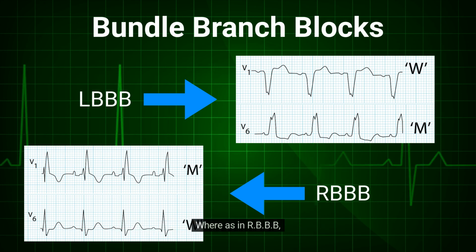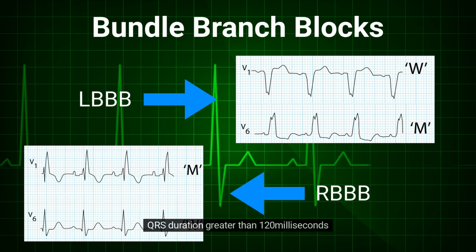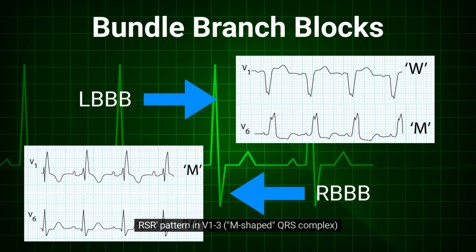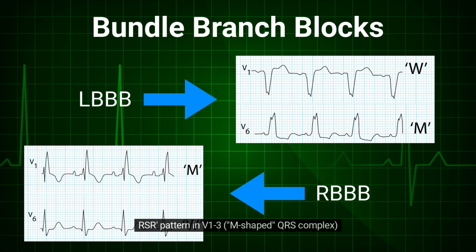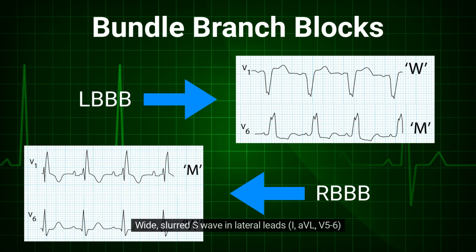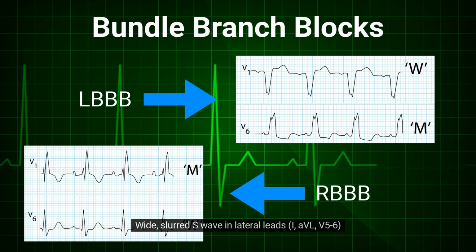Whereas in RBBB, QRS duration is greater than 120 milliseconds. RSR pattern in V1-3, M-shaped QRS complex. Wide slurred S wave in lateral leads I, aVL, V5-6.